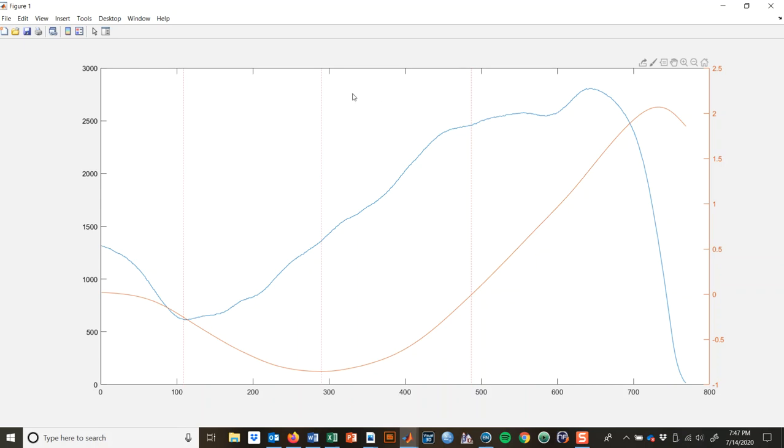So that's the same exact identical. These 2 phases here, eccentric braking, if you think of other phases, like the 2018 paper from John McMahon and colleagues, they called this the braking phase. It's the exact same. They called this the propulsion phase. It's the exact same. The only thing is the nomenclature for how we use it or how we define them. So all we've done is separated these out. Now, in that same 2018 paper from John McMahon and his team, they called the unweighting phase what we have here as unloading and eccentric yielding. So if you broke those into one phase, that would be their one unweighting phase. We've just broken this down to be a little more precise, at least in my opinion.